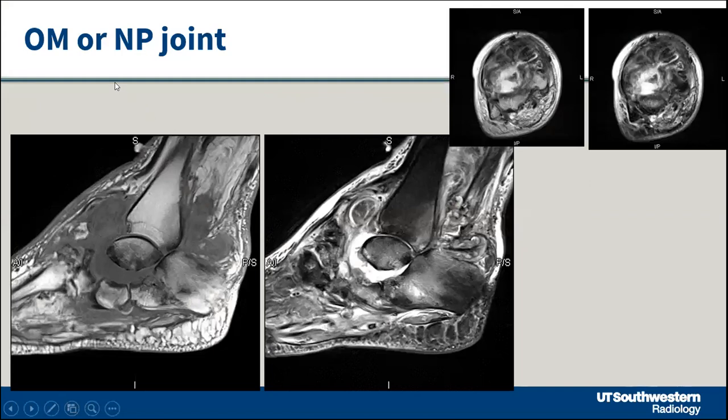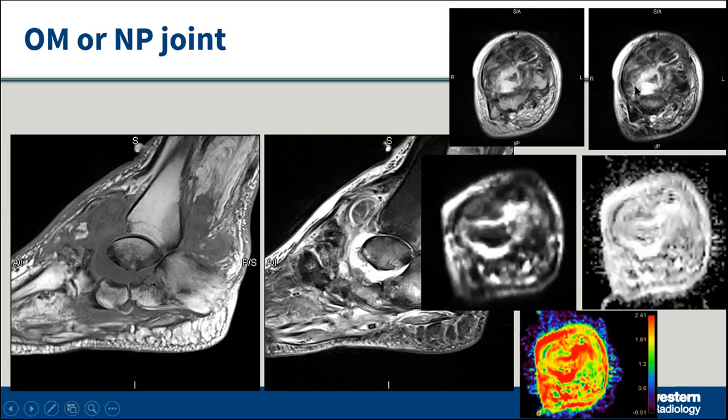Then moving on to the domains of infection and neuropathic joints. Well, when you have collections like this, you're not sure if it's neuropathic or infection, although we don't have any ulcer to see. Sometimes they're pinpricks, so you don't know if they have any ulcer or not. But it's fairly easy. First of all, you look at Dixon images, on the post-phase images, you'll see cystic changes, or you'll see these margins of the bones very sharply. So you're dealing with neuropathic and not an area of infection, which has ill-defined margins.